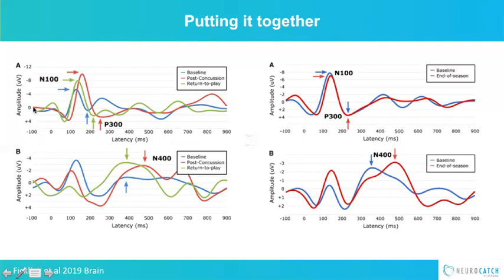Let's go back to the beginning of the module. First of all, we're looking for the flat baseline before the stimulus starts. Then we're seeing that there's this P1, N1 going into a P3, so the sensory attentional peak to the tones.